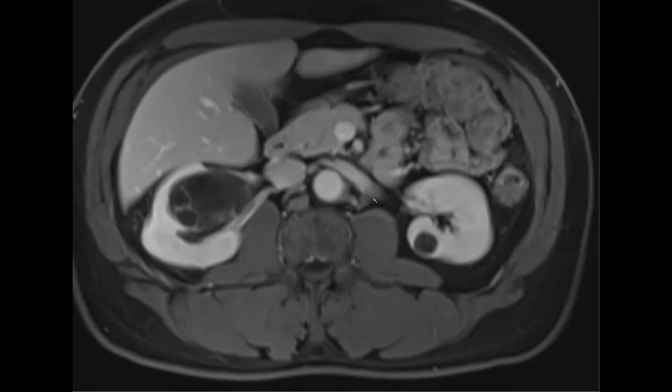But if it's a cystic mass, it's either a cystic RCC or a MEST, which more often than not they take out, especially when the patient is younger. Even in an older patient they may consider it, but in a younger patient, especially this patient, where we find it's causing hydronephrosis, they don't wait for a biopsy, they just take the lesion out because it has to come out anyway.